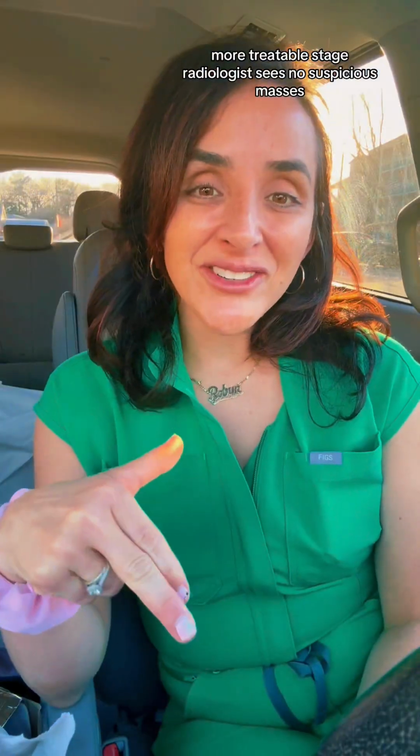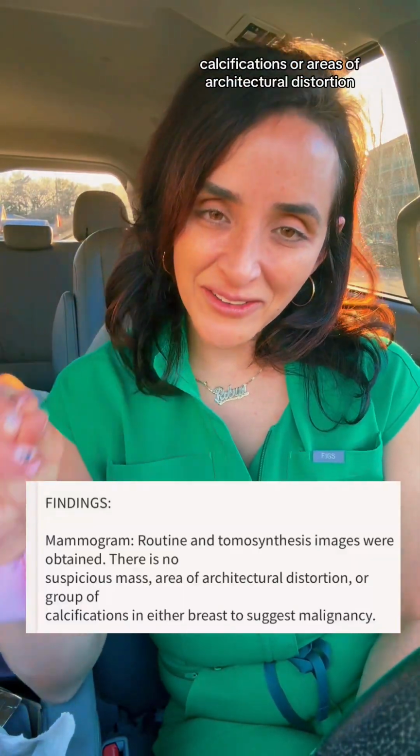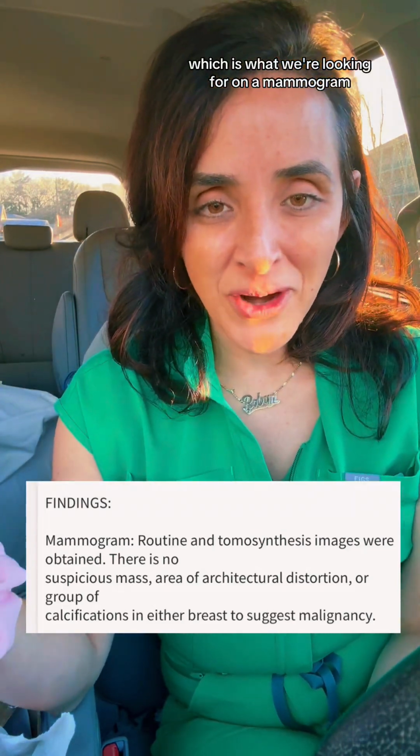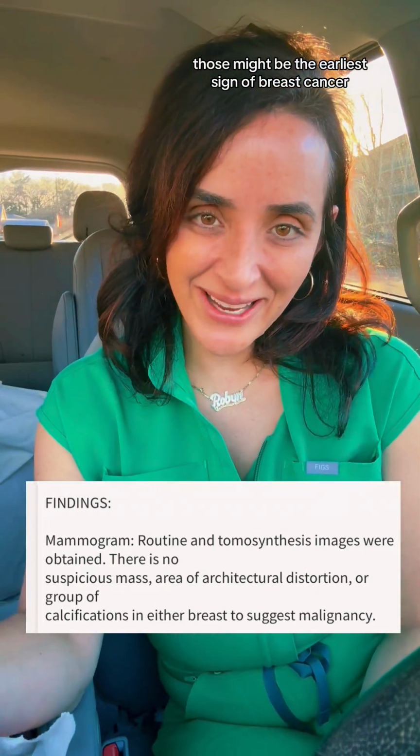Also, dense breast tissue increases your risk of developing breast cancer, so it's like a double-edged sword. So you might want to consider adding ultrasound or MRI depending on your risk factors, which allows us to find smaller breast cancers in an earlier, more treatable stage. Radiologist sees no suspicious masses, calcifications, or areas of architectural distortion, which is what we're looking for on a mammogram. Those might be the earliest signs of breast cancer.